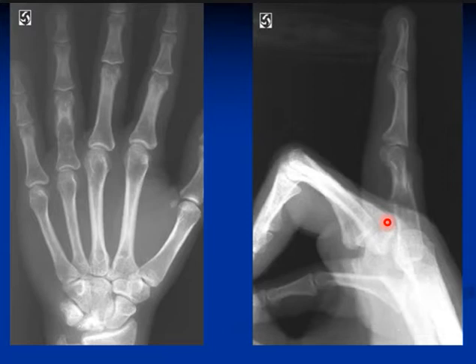Chondroma. Enchondroma is the most common benign lesion of the hand bones, and most commonly presents with pathological fracture. It is asymptomatic, the patient has it for years, and with minor trauma the bone breaks and gives the patient a pathological fracture. You can see here there is the fracture.